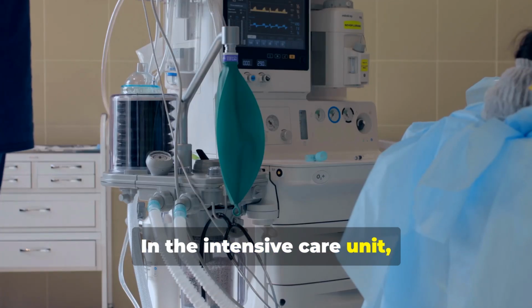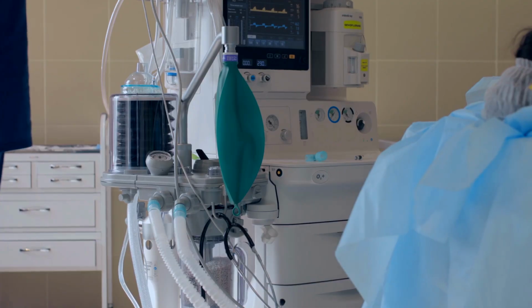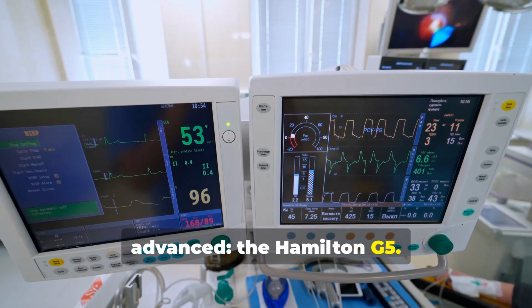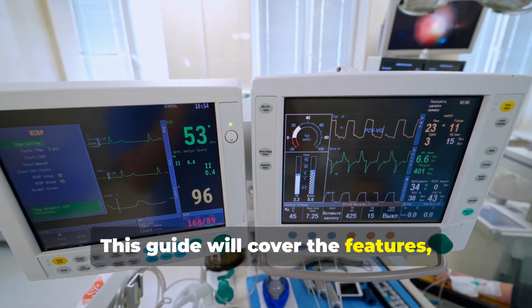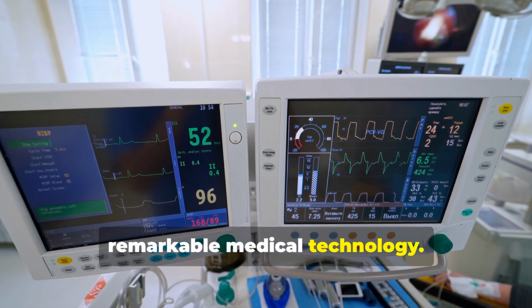In the intensive care unit, mechanical ventilators are critical life support tools. Today, we're exploring one of the most advanced, the Hamilton G5. This guide will cover the features, functions, and clinical applications of this remarkable medical technology.